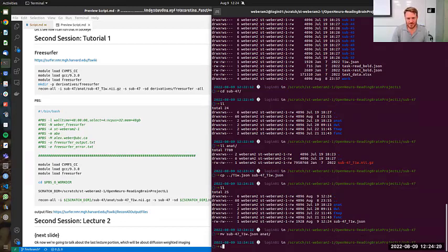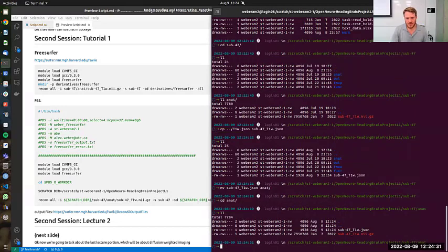Sorry about that. So I would likely want to copy that generic T1 and put it into each subject's folder. The way that they have uploaded this has created a little bit of work for us, but it's not too difficult to get around. And I think if we ran the BIDS validator, it would say, where are the JSON files?